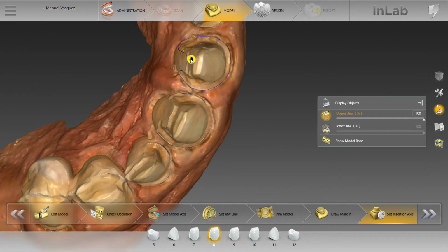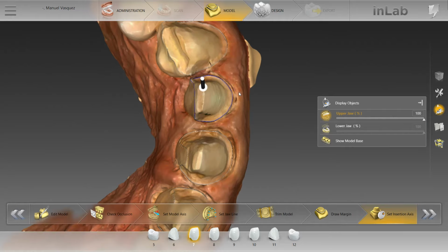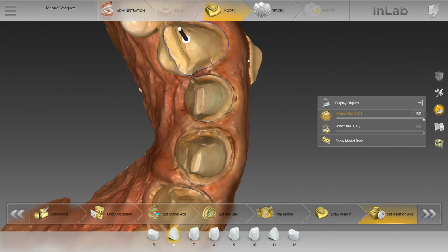And I'll fast forward through some of the more mundane things, and if there's anything I want to kind of touch up on or go more in depth with, I'll slow the video down and kind of walk you guys through what I'm doing. So enjoy.